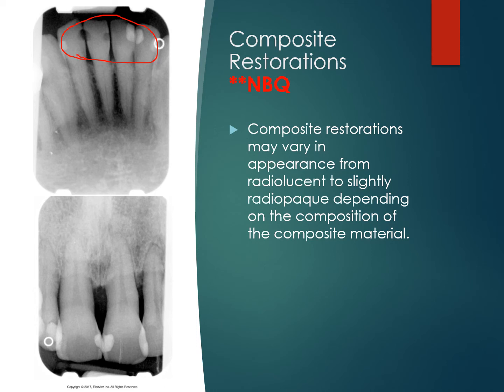But also, we would know that this isn't a cavity because we would look inside our patient's mouth and we would see, oh, you have a white material here, right? So again, the reason we don't wait until our patient leaves before we interpret our images is because we need to be able to see that this is, in fact, just the kind of composite material that was placed that is radiolucent.